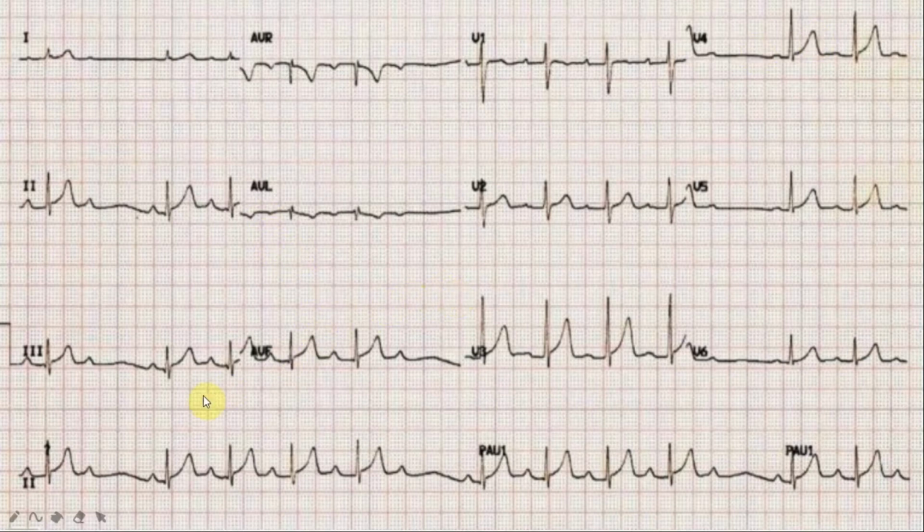Thank you. I am going to interpret this ECG in a very systematic way. However, if there is an elephant in the room, that does not need an introduction. The elephant in the room in this ECG is non-conducted P waves suggestive of a second-degree heart block. I will come back to it in a second. Let me talk you through the usual stuff at first.